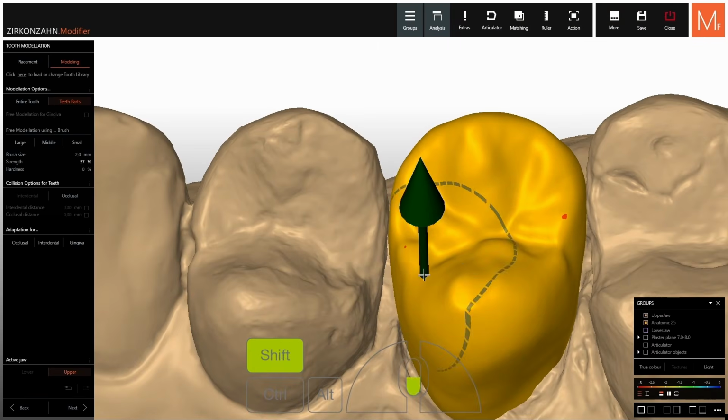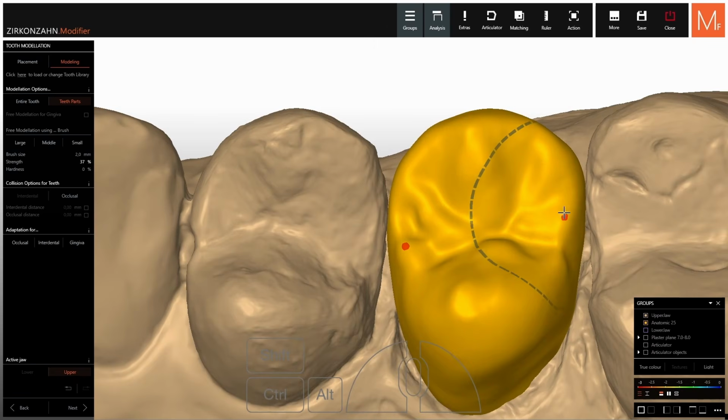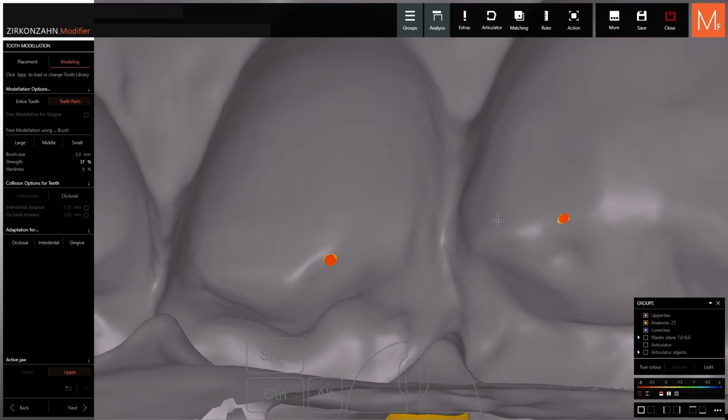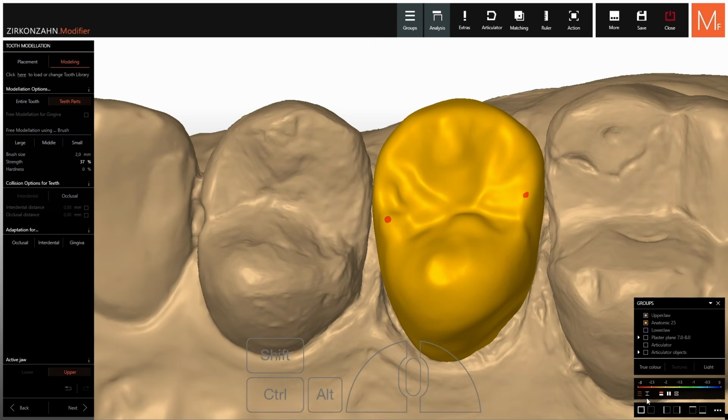Now, once that is done, we're just going to quickly focus on the contact points. You see the red areas? These are direct intrusions to our lower jaw. To define these a bit further, we go down to the right, into the analysis mode. If it's hidden, you can just click up in the taskbar on the Analysis button. It will pop back up.